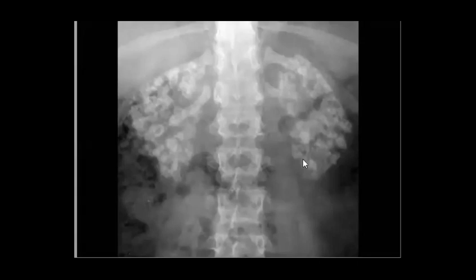So this one is medullary nephrocalcinosis, which is common. Yes, Ala, Kareem, everyone, Rehan, Ines. Okay. And you are going to think about hyperparathyroidism. The most common cause in adults will be hyperparathyroidism. Perfect. Medullary sponge kidneys. Other causes like Lasix in infants, if this patient is an infant.